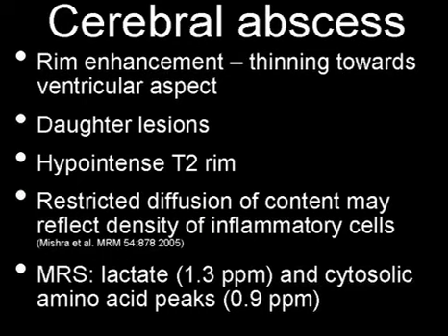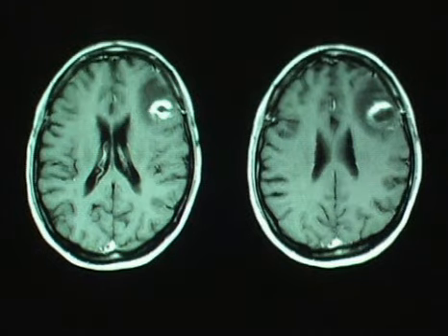of inflammatory cells there. We can also use MR spectroscopy, taking a look for lactate and amino acid peaks seen on the lower end of the ppm spectrum, and we'll see an example of this. So here's an example of an older woman. She was a sort of a party socialite type of person who ended up having some focal neurologic symptoms and headaches, and she was referred to our institution for a malignant glioma. And looking at this initial imaging, you can imagine why.